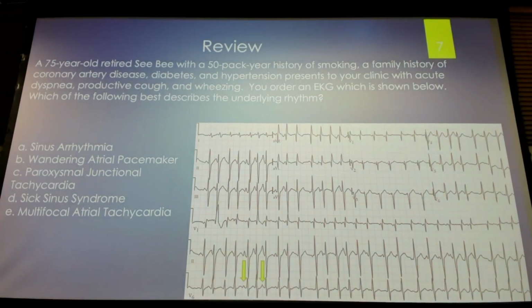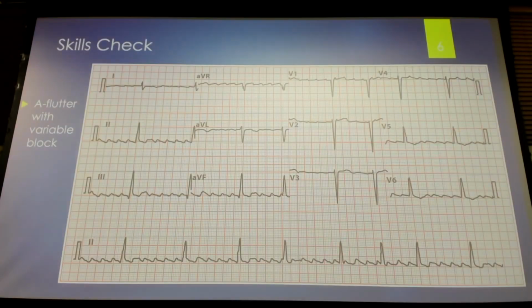Question, Matt? Yes. For the previous slide, would you consider those delta waves, where the QRS complexes are? Almost all of them have it, almost resembling WPW. You wouldn't be wrong if you were like, man, I'm really concerned that might be a delta wave, but it certainly comes up and comes over on the majority of these. So it is possible. We'd have to see what their underlying issue is.